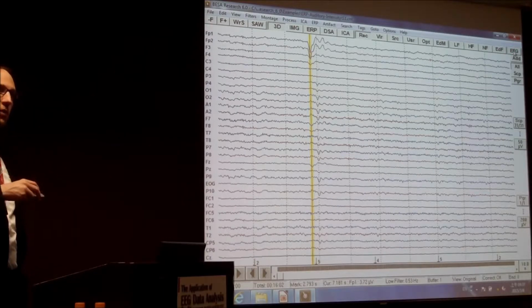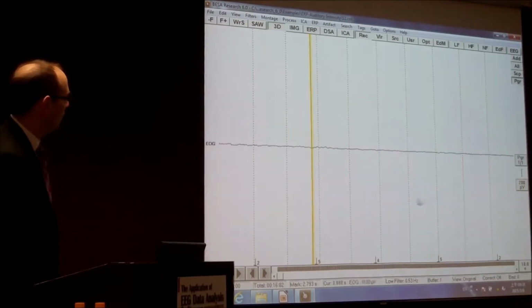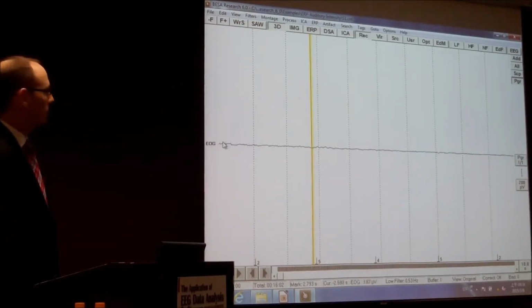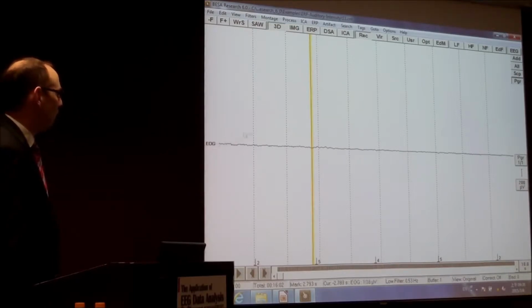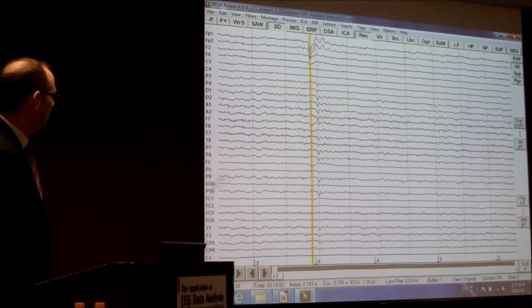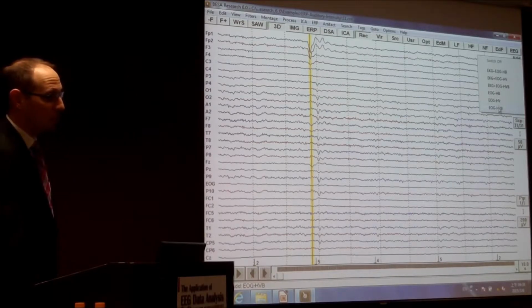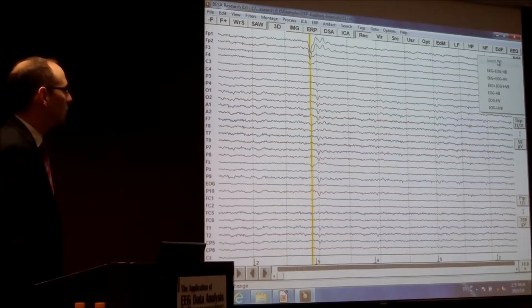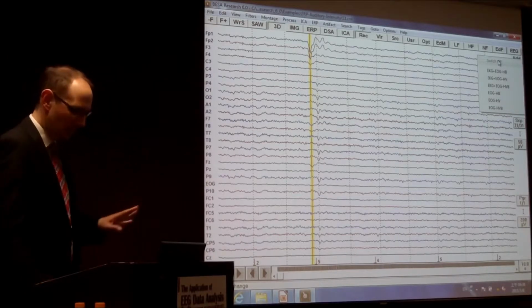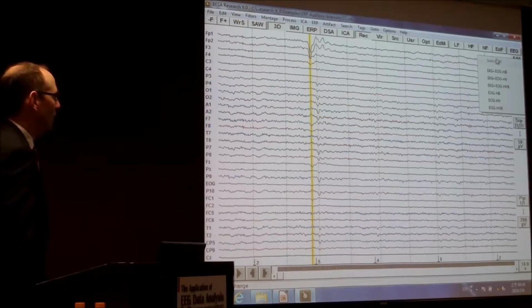Sometimes if you have polygraphic channels, you can also toggle to the polygraphic channels. Then they are here. We have a polygraphic channel. This is the EOG channel, that's the eye movement channel. Then we have the scalp channels, or all. Then the EOG channel is here. And you can have additional channels. They're all switched off at the moment because they're not really defined at the moment. So I don't know, maybe they're defined already because we will define them in a few minutes.